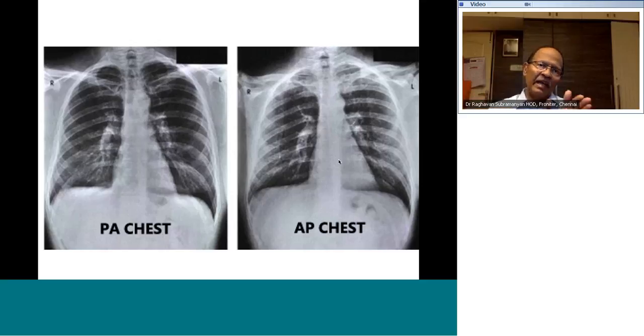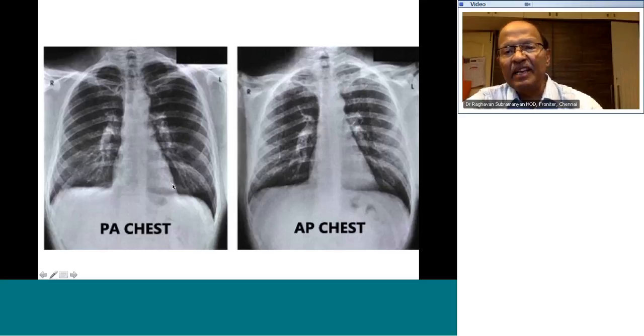The X-rays are diverging. They enter the heart and exit from the heart and exit from the chest at the posterior wall. It becomes wider and it gives an apparent cardiomegaly. The PA view does not cause this apparent cardiomegaly. Therefore, when you are measuring CTR, cardiothoracic ratio, in a portable X-ray at the bedside, please be very careful about describing cardiomegaly. Okay?